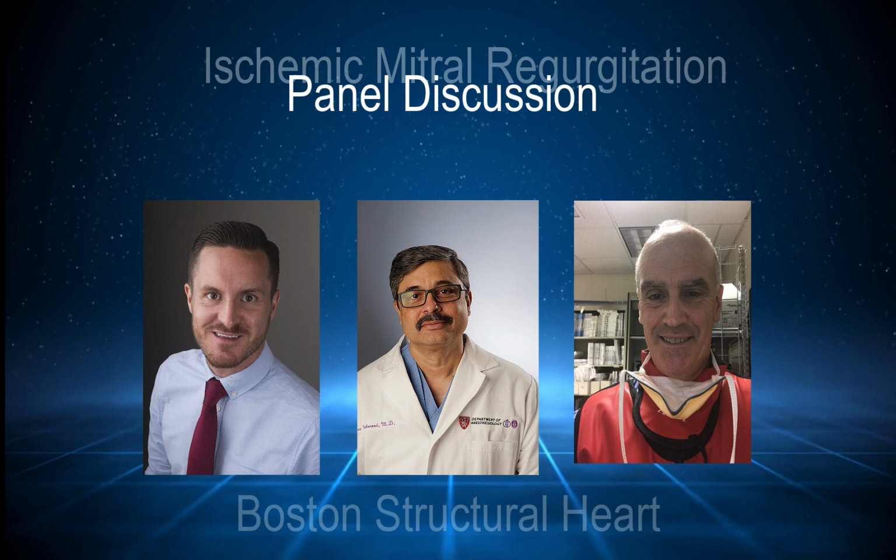My suggestion, the thought process, while I was trying to be the devil's advocate and take the contrarian position, I think that the reversibility of the MR with nitroglycerin in this acute sense suggests that if we were to restore blood supply to the myocardium in this high-grade stenosis, the myocardium is alive, which means it is ischemic. So that's why I think that would have been my approach as well. And for those previous images we examined for coaptation reserve, is this something you would look at as well? And is this something you routinely look at, or what patients do you look at coaptation reserve in?